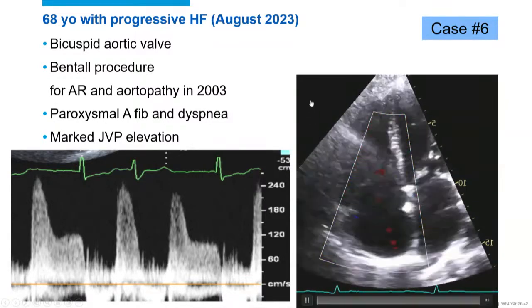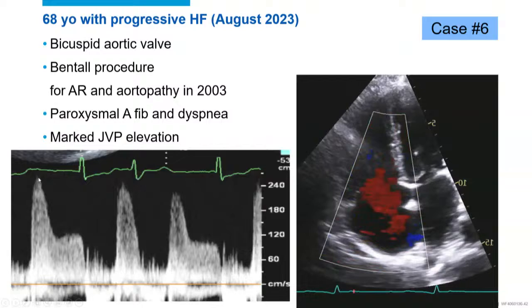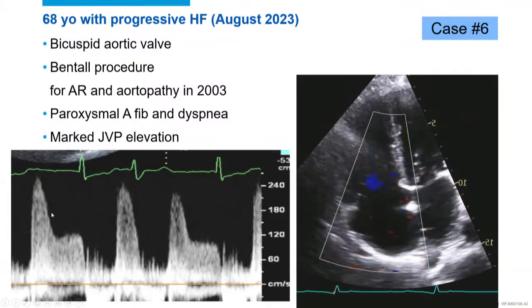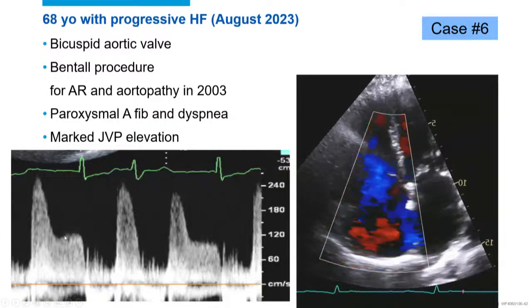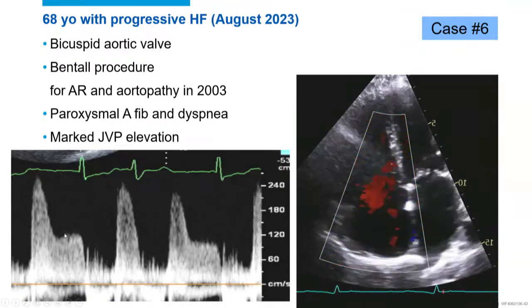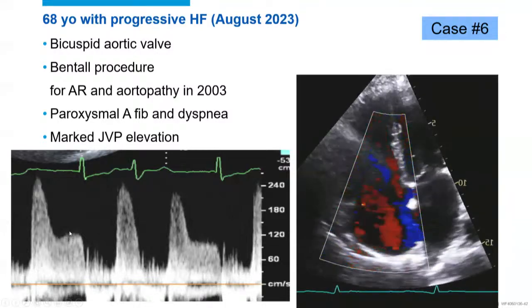But when you look at this, what's interesting is that the RV pulmonary regurgitation velocity comes down rapidly because of this square root sign of the RV diastolic pressure, and then in late diastole, it goes up again. You cannot go up from the RV, because this is a change from the PA to the right ventricle, right? Something has to happen to the PA diastolic pressure to change that increase in diastolic pressure, right?